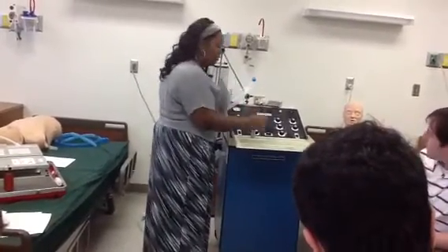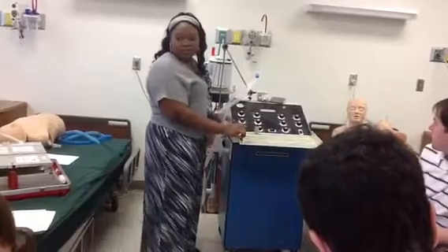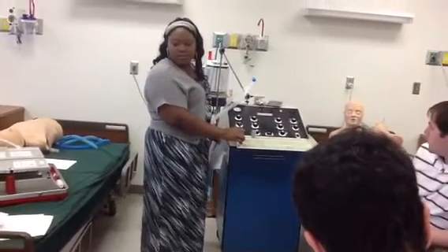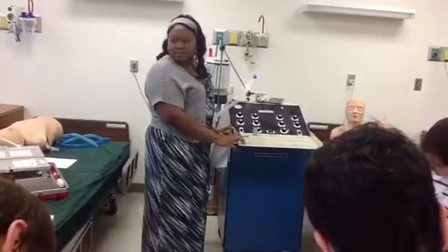J is your manual button. This button allows you to give the patient either a normal extra breath or a sigh extra breath. And sighs, y'all know what a sigh is. We all do it: a big deep breath and then you exhale. J is what? It's your manual buttons. So there's two of them, a normal and a sigh.